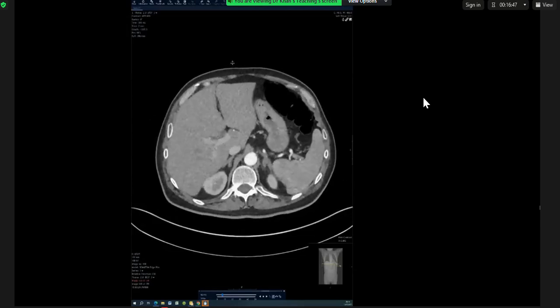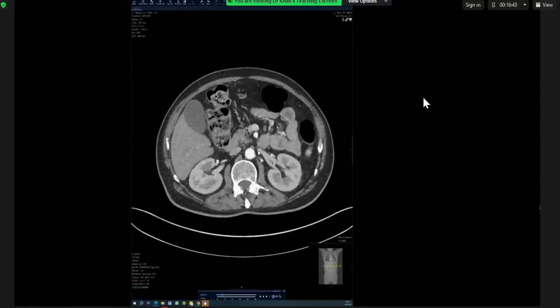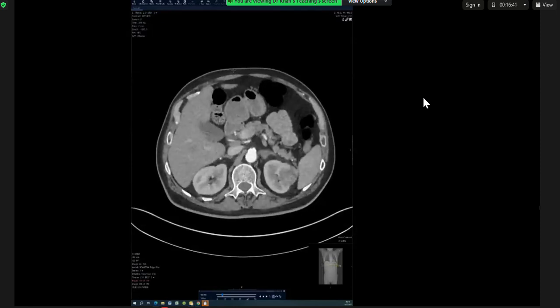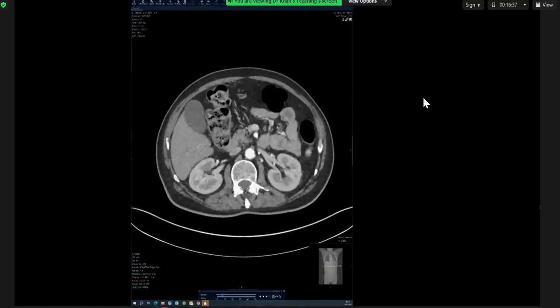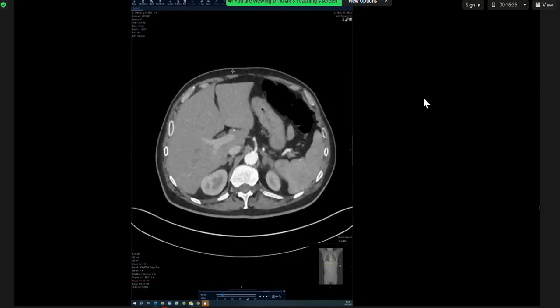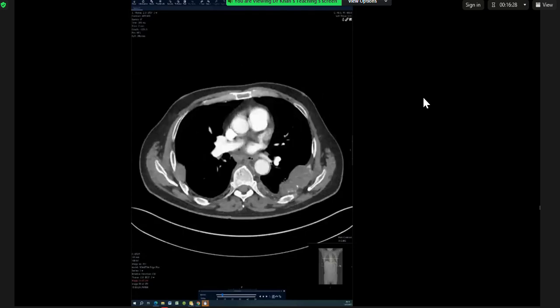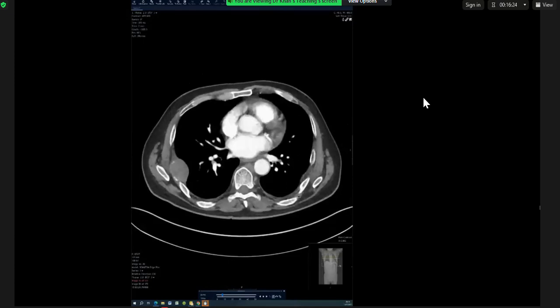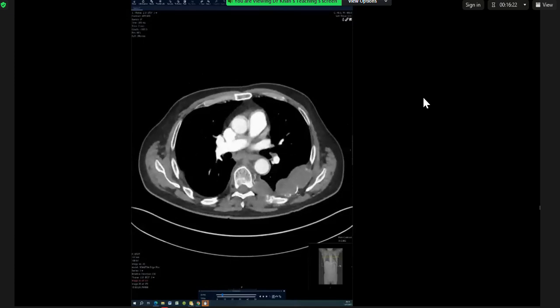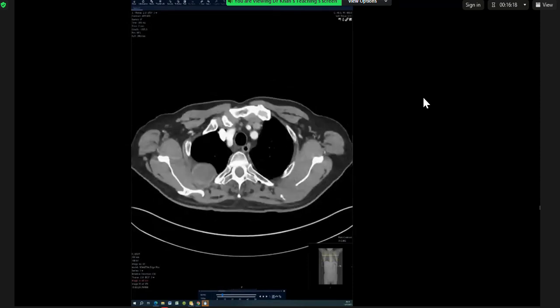Normally, I would look to see if there are any adjacent lymph nodes, and I would check to see if there's involvement of Gerota's fascia, as that would change the classification. I would look for other lesions, and I would interrogate this in a coronal view. And apart from that, if I'm only given this and there's no abdominal imaging, this is as far as I can take this image. Okay, so you're suspecting an RCC with bone metastasis, I'm guessing?